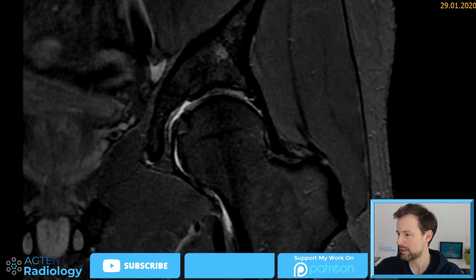There's a Berlin Case Viewer online as well. So one question I would have for you guys: do you think it would be helpful if you could scroll through the cases in parallel with me? For example, on your phone you would have the same cases that I just showed you, and you could scroll through them in parallel with me. If that's something you would be interested in, just let me know in the comments, because we could certainly try to do that with the Berlin Case Viewer app that I used in my last or second last video. That's a tool we could certainly also use for this kind of stream, if that's something you would be interested in, or whether you just want to keep your eyes on the video and follow my mouse.